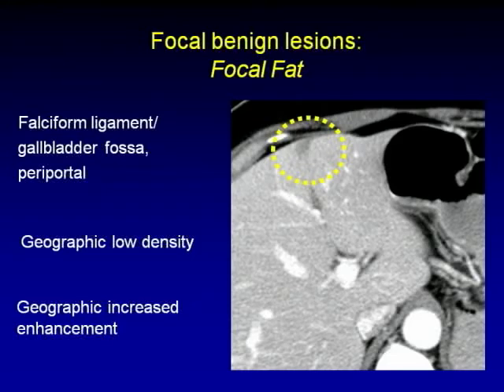You're not going to worry about this. They're going to say rule out tumor, follow it up. It's triangular, it's in the falciform ligament. So these features are all very reassuring.